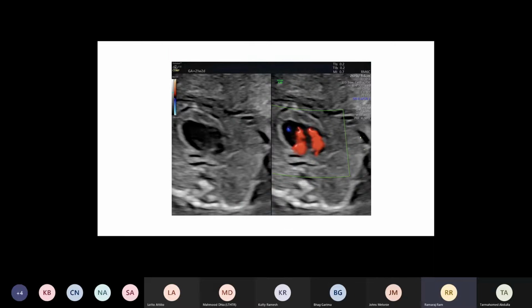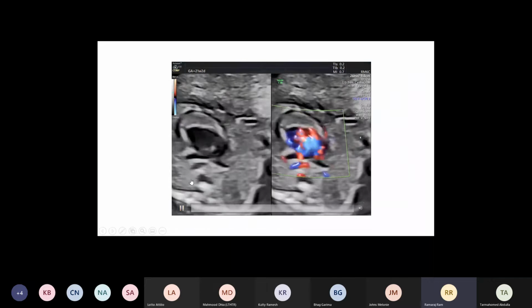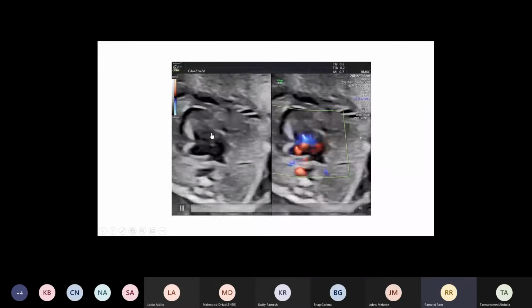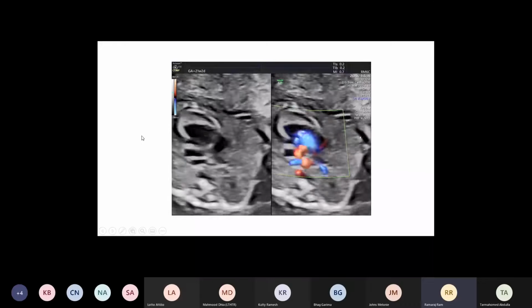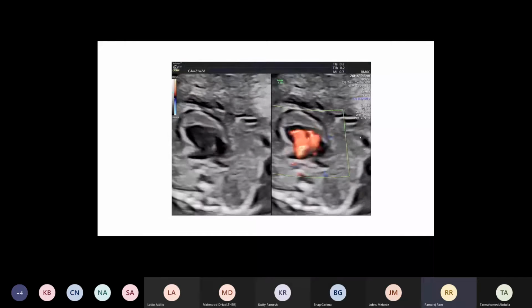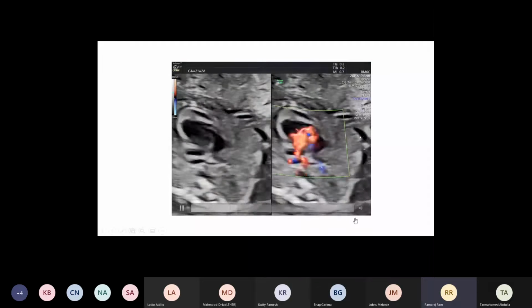Yeah. So here is an example of, again, a 4-chamber abnormality. What you're seeing is a double inlet ventricle. You're only able to see one big ventricle, often LV. The anterior chamber is often connected through a VSD with a small chamber. Again, with the outflow tract, it can be associated with different associations. You can have DORV, or normally connected, or TGA association with outflow tract abnormalities. But just with the 4-chamber view, you can pick up this abnormality reasonably well. Next one, please.